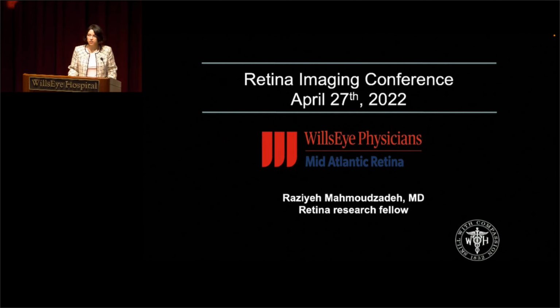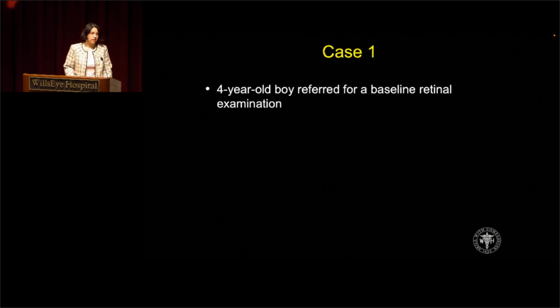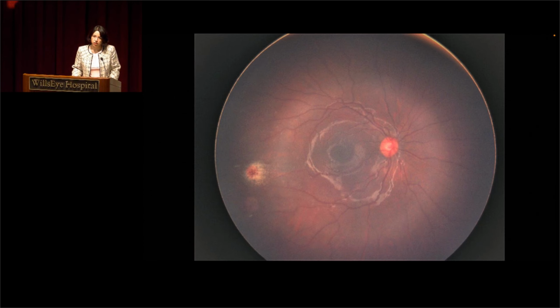I'll be presenting today's imaging conference. Our first case is a 4-year-old boy referred for a baseline retinal examination. Dr. Shahlai, would you please walk us through these images?